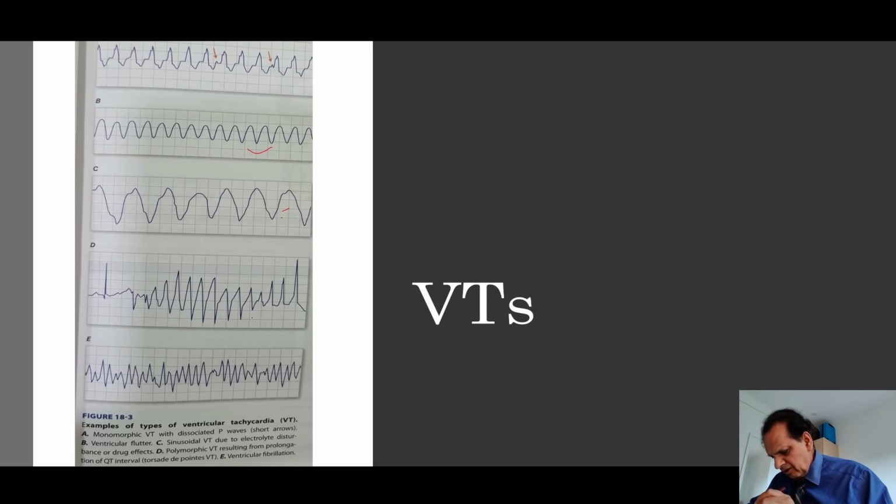D1 is the polymorphic one, screw pattern, change of axis of the ventricular tachycardias, and this type of rhythm. And the ventricular fibrillation, this kind. Never confuse with the artifacts, but this rhythm is such a scary rhythm. So all the types of ventricular tachycardias I have shown you here.